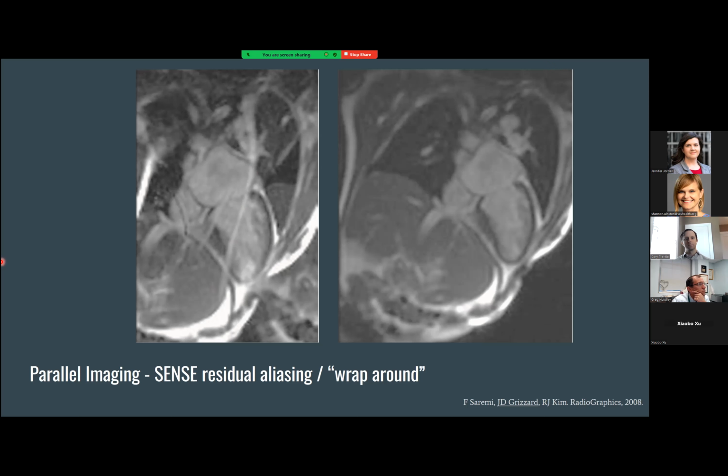So we can sometimes shift it closer to the edge of the image if the parallel acquisition factor is reduced. So these are some nice examples here of where they've made those adjustments, and the right-hand image is free of the artifact coming through. And you can appreciate that the field of view, if we look at the width of this image, has been increased from our image on the left.